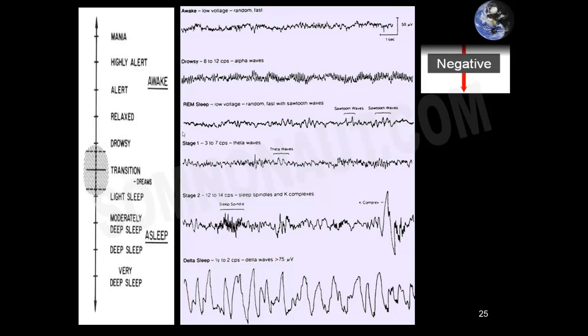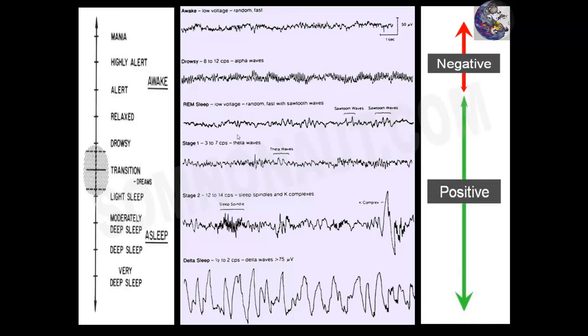Z ratio depicts the global EEG predominance like a compass for our EEG. Is there more slow or more fast? And while it's taking into consideration the voltage, it's also taking into consideration the frequency of that voltage. So you end up with a value, an index, that takes into account the relative contribution of the slow frequencies versus the fast frequencies. And it does it in short 1-second increments.